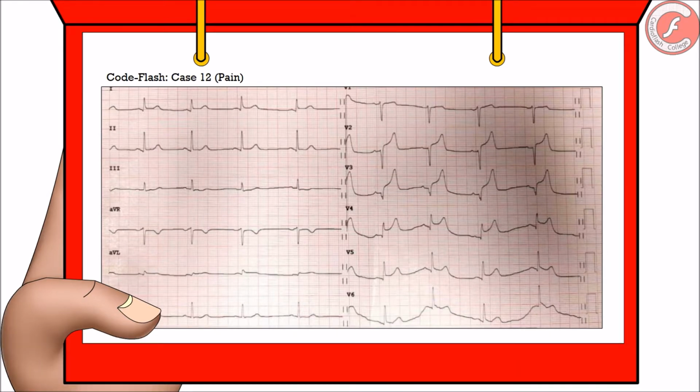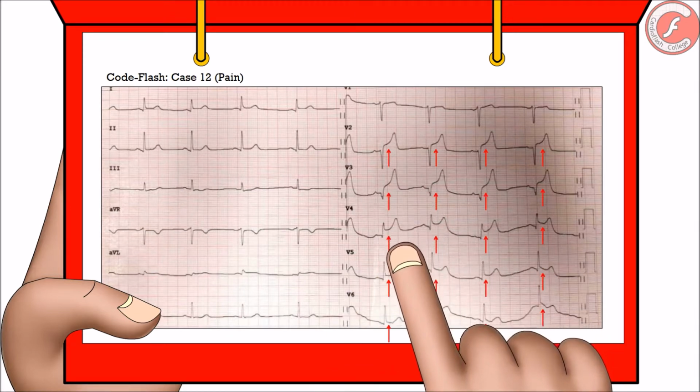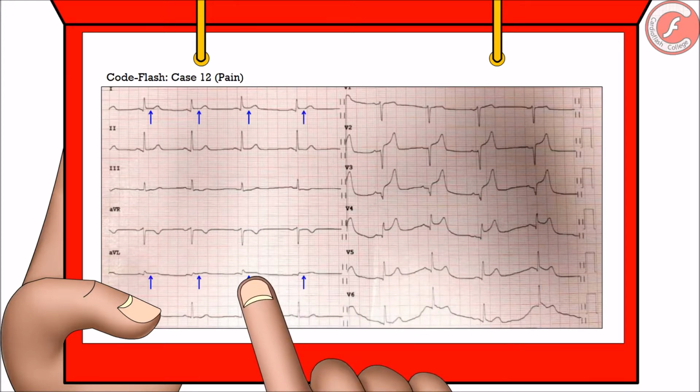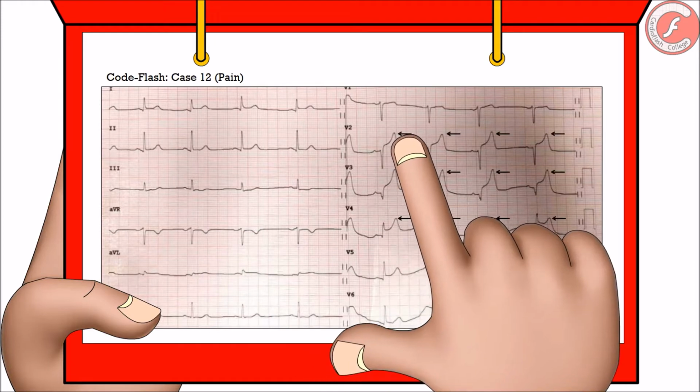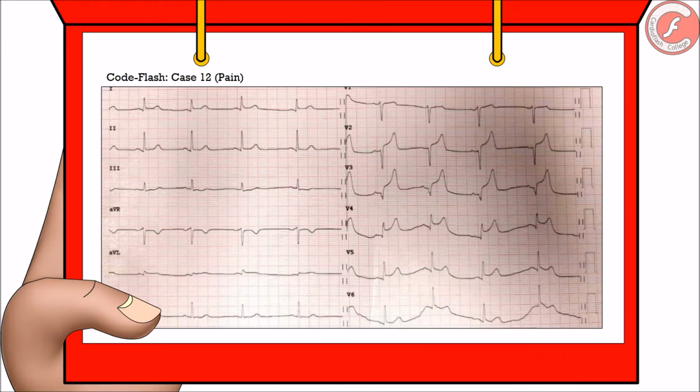That's it. In this electrocardiogram, the first of some that were performed before cardiac catheterization, a broad elevation of the ST segment is evident in precordial leads and also a simultaneous and discrete elevation of the ST in the lateral wall. Besides, there are hyperacute T waves from V2 to V4 with poor progression of the R wave in precordial leads, which suggest an early character of the findings.